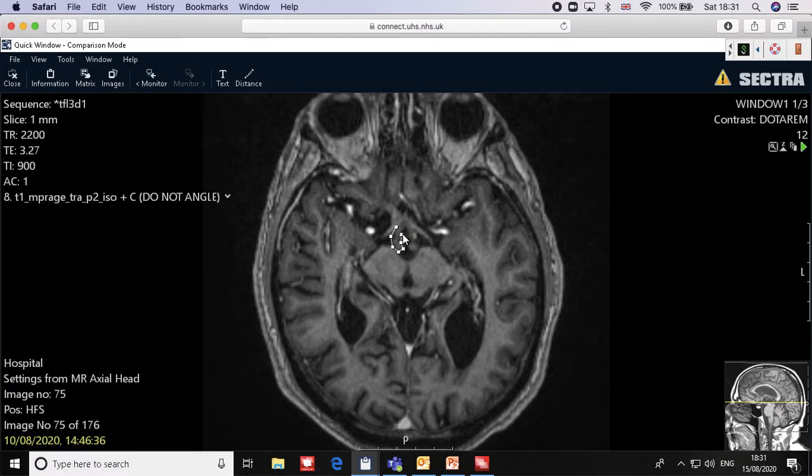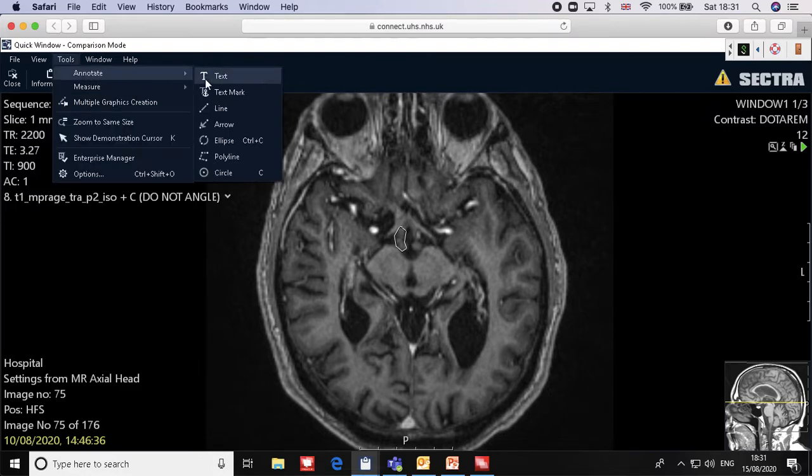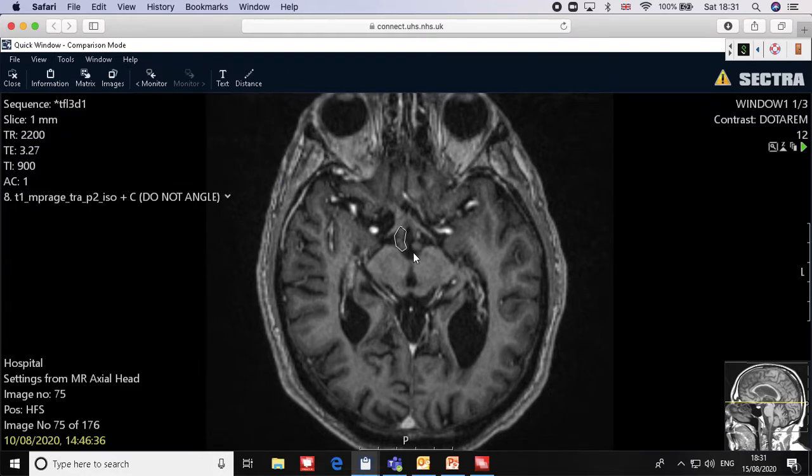Okay, good. So let's draw the mammillary body. You can see it clearly. It's very nice, and it's on either side as well. So I try to do it again. Polygon, go there and do it, and draw it. Okay, you can see it like that. And this is the first slice. Anyway, it stopped working.